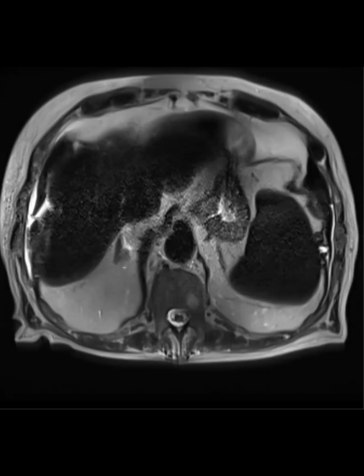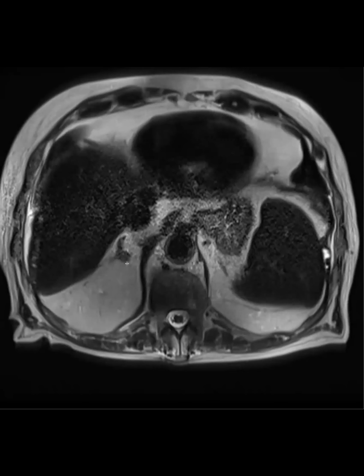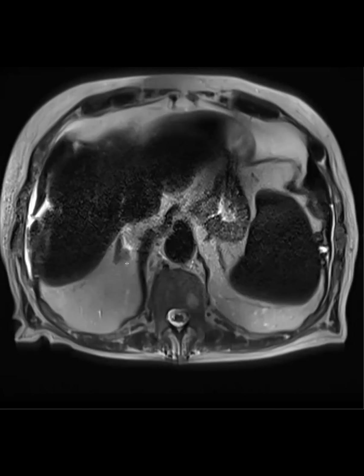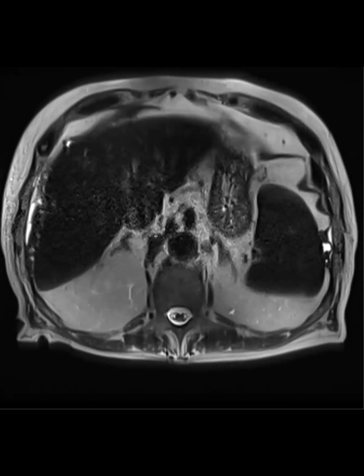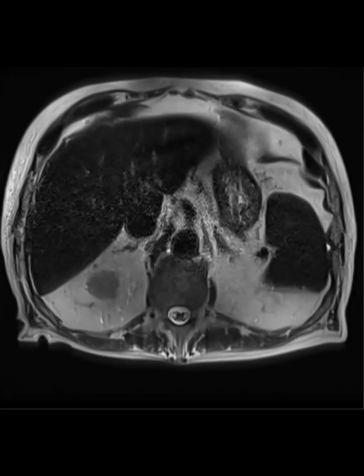Pretty basic concept, but something I embarrassingly didn't actually know. And I've seen a couple of pitfalls from it recently, or a few people mistaken it. So can someone tell me what the structure is right here?